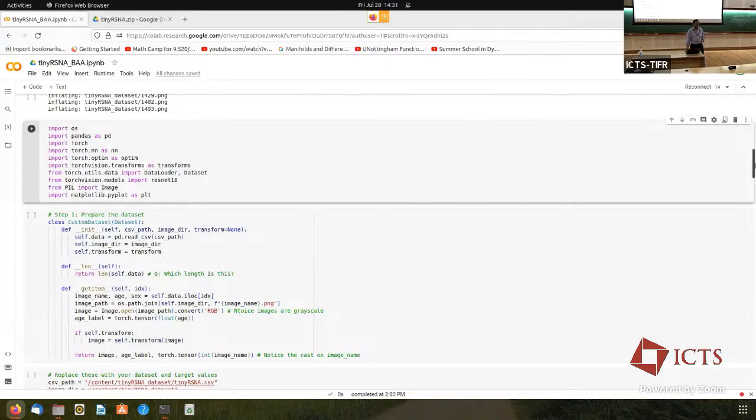What kinds of errors could arise? There could be a mismatch between the data file, the labels file, and the number of images. Or your neural network failed for some reason. It didn't produce the right output and went quiet. It quietly did not give you the right output, but it did not throw an exception, so you don't know about it. Something has gone wrong and you are left to debug it. Those are the questions that come up in active practice. Hopefully that will not happen here today because everything is so straightforward.